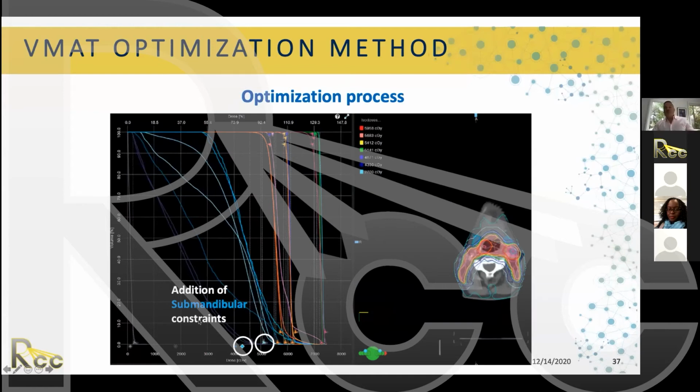Also, keep watching the optimization view. I don't know if you have the actual doses in your treatment planning system, but it gives you the actual dose. So you can see, okay, I've already met the constraint for the parotids, which is 26 gray mean dose. So I'm going to stop right there. Then if I need to tweak it a little bit, I will do it later.